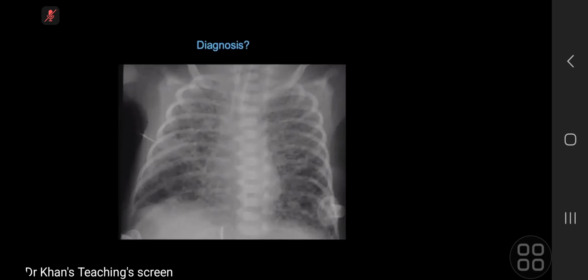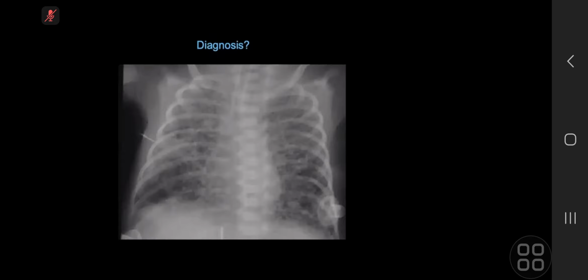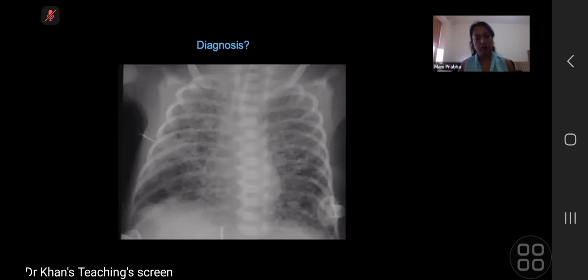So again, I would correlate with the patient's birth history and if they're premature or not, and how old they are. Preterm infant on ventilation. Okay. So given that the patient's on ventilation and was preterm, I'll be concerned about a complication of hyaline membrane disease, such as chronic lung dysplasia or pulmonary interstitial emphysema. Which one do you think is going on here?